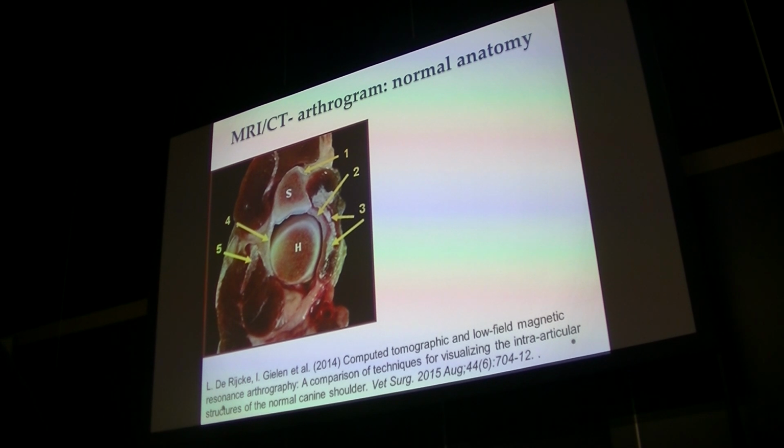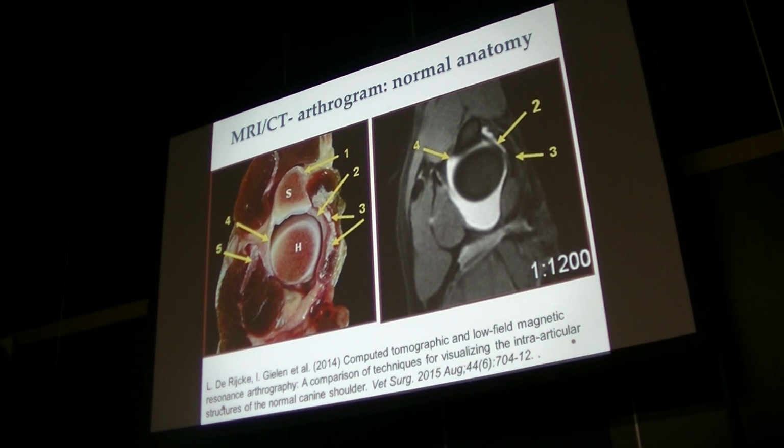Okay, what about the glenohumeral ligaments? There are nice studies performed. We also performed an anatomic overview or correlation of intra-articular contrast applied in CT and in MR, and compared it with anatomical images. We can nicely evaluate the glenohumeral ligaments if we know where we have to look.